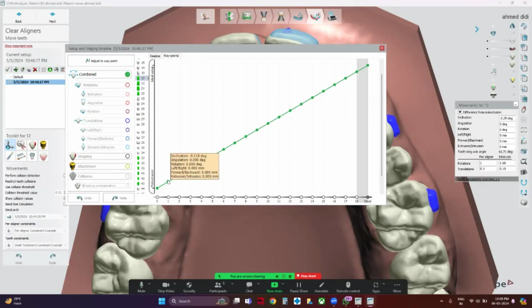0.1 degree over here. All right. So what is the normal allowed angulation? 1.5 degrees. Yeah, correct. So you can imagine that you at least have 10 times the possibility. So let's check some other tooth. Let's check 1, 1. Even lesser than that. Let's check 2, 1. 0.1, approximately similar. And let's check this: 0.03 and rotation of 0.3.